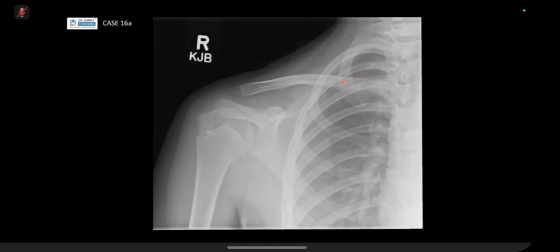Because like what Dr. Kapoor said earlier, when you have more aggressive periosteal reaction, the bone has not had time to lay down, so you get partially laid down bone, and then with destruction, you get Codman's triangle. Can you imagine that the periosteum is trying to lay down bone, but part of it is just not, because it's being eaten away by whatever destructive process it is. So there's smooth periosteal reaction and bone expansion.